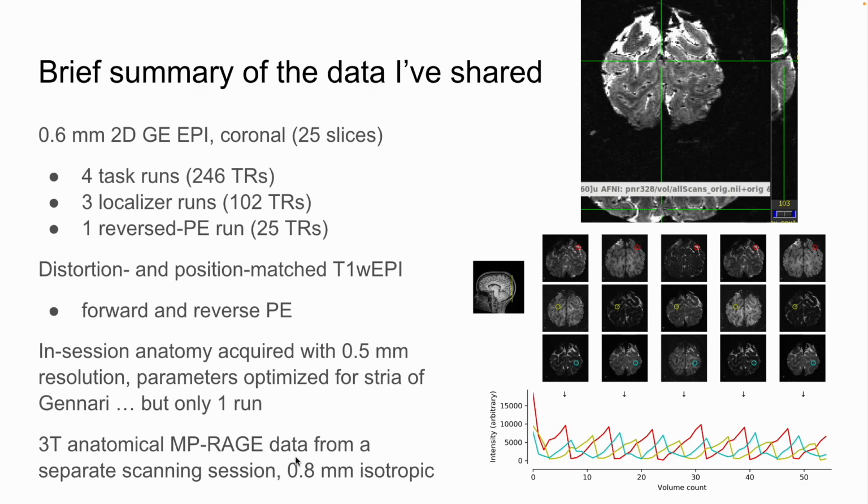So I'll see a lot of coronal slices, and I sometimes remember to show a little axial and a little sagittal section so you can see what a really tiny bit of the brain I am covering. But we can get a 2-second TR. Everybody knows that there's multi-slice, multi-band acquisition in the world.